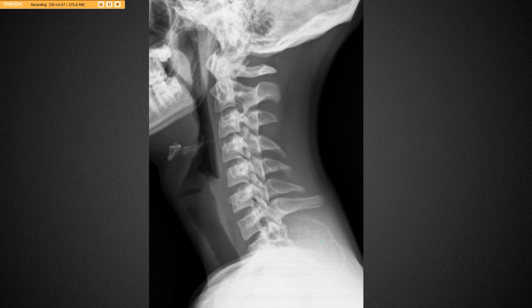And we look down here at their spinous process, and you can see that we've got a big expansile lesion here. Is that T1, 3, 4, 5, 6, 7, T1. Yeah, that's the T1 spinous process. So posterior element expansile lesion, two top differential diagnoses are ABC and osteoblastoma.